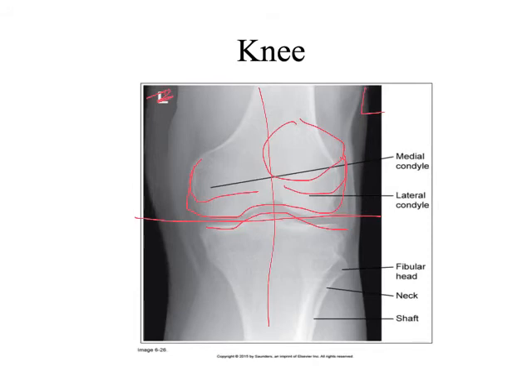This is a little bit oblique, I agree. This is marginal, and you're right, there's a little bit too much superimposition right there. That's a good point. Ideally, we'd see more minimal superimposition. And I think that's good. Soft tissue is critical on this image.